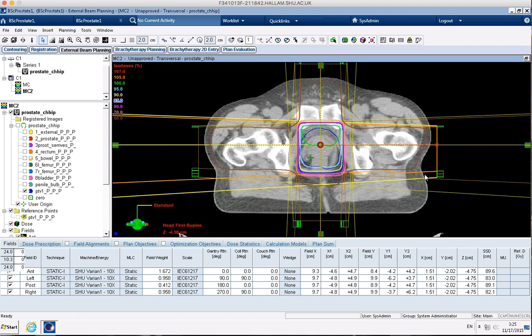If we think of a wedge as an arrow pushing dose in the direction we want it to be in, if I just have a go at drawing a line on here, we're wanting to push dose in that direction, if you'd agree with that. So if we're going to push that dose in that direction, then that field is no use to us, because if we put a wedge up there, we've only got a choice of that way, or if I try and draw in 3D, sup to inf, so that's no use to us.